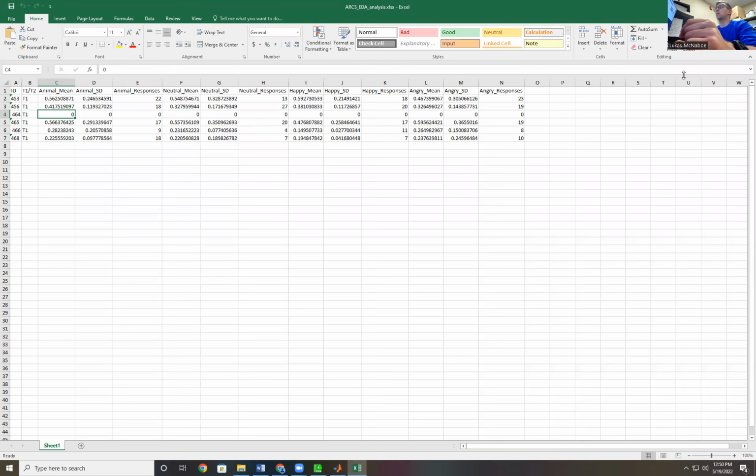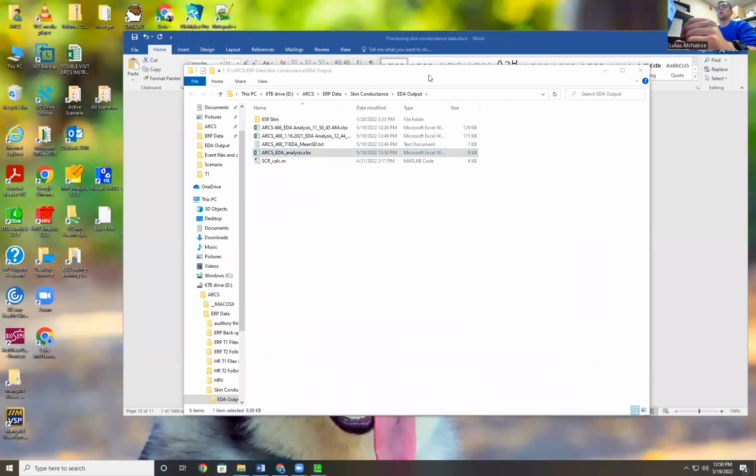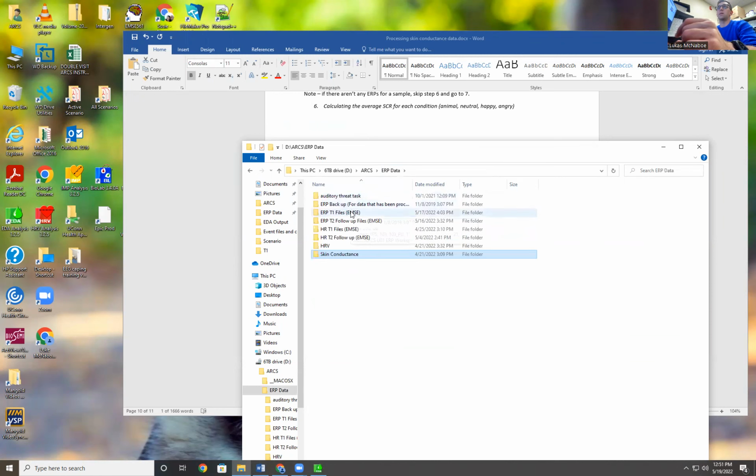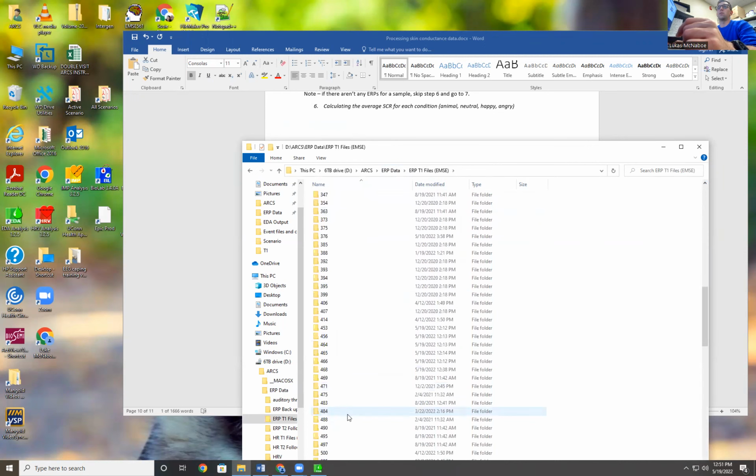It should be saved, but if you did have to change anything, just good practice, save, close, close out of MATLAB. And then to make sure this folder doesn't get too cluttered, what we'll do is select those two for the file that we're working on, and then cut them out, Control X or right click cut, and paste them into the folder with all of their other data.